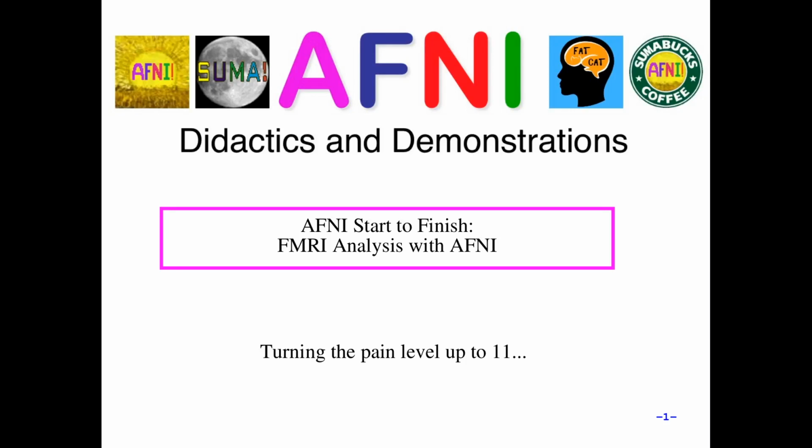Okay, this next set of videos is around single subject analysis called AFNI start to finish, and we'll basically use afni_proc.py to run a full first level analysis, a full single subject analysis from pre-processing through linear regression, and then at the end hopefully we'll run a simple group analysis with results that would have come from this.